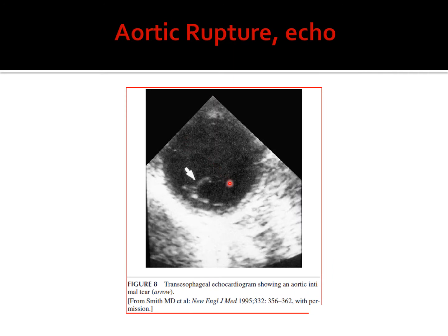This is a patient who had an echocardiography secondary to the aortic rupture, and you can see here the transesophageal echocardiogram. You can see here the aortic flap, or the intimal flap. Usually it is the intima that breaks, and you can see here this is the intima and there is discontinuity on the opposite side of the intima, and this is the intimal flap. There is the aortic dissection and the portion of the aortic rupture.